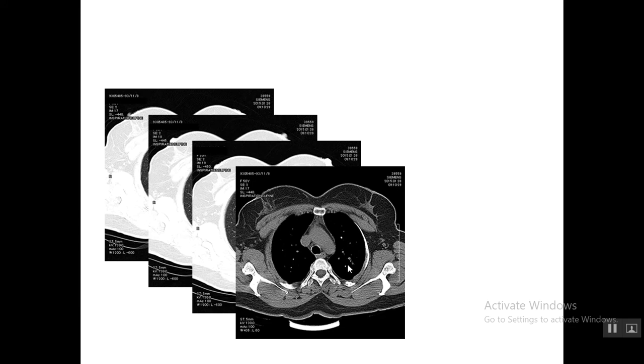But the cystic structure has an additional abnormality, and you notice that a vessel passes through the cyst. A large vessel passing through the cyst is more detectable here. The diameter of the vessel here is obviously different from other vascular diameters, and in the mediastinal window again this vessel could be slightly more prominent than other vessels.